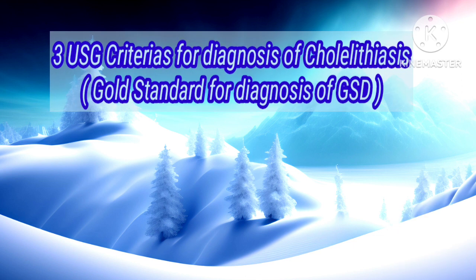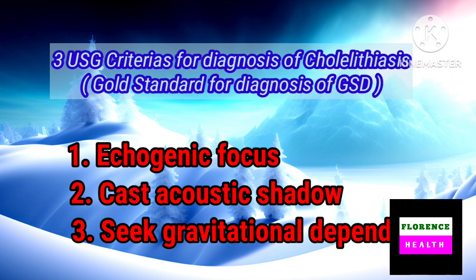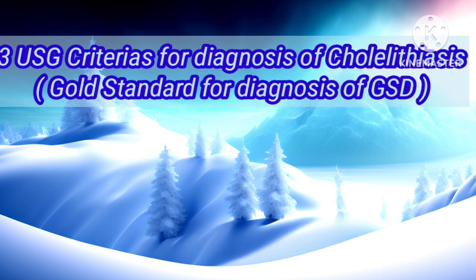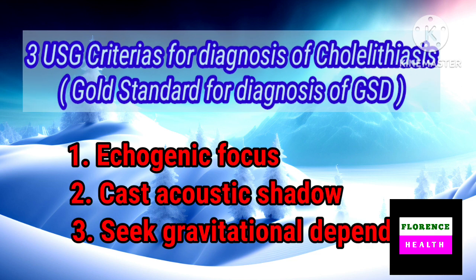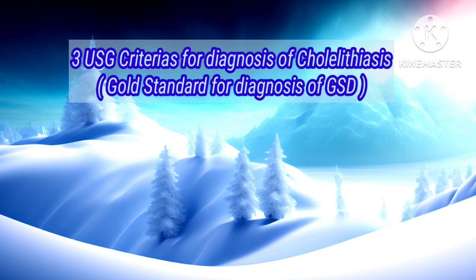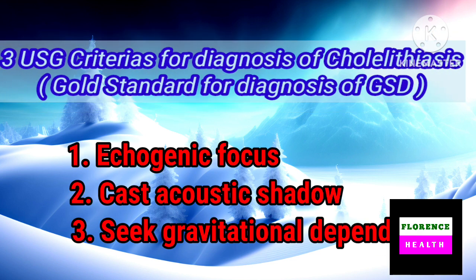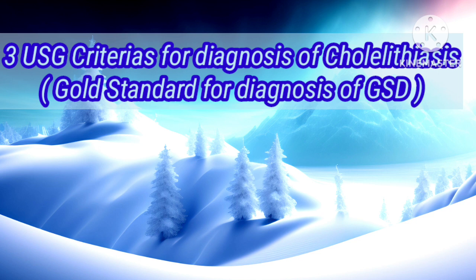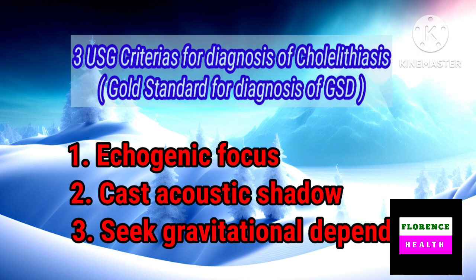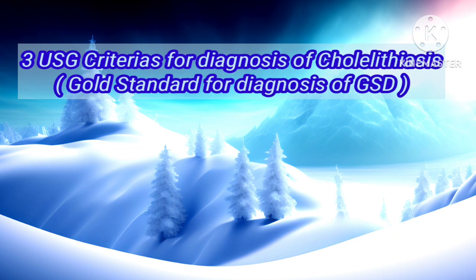There are three diagnostic criteria, or three sono-criteria, for diagnosis of cholelithiasis or gallstone disease. Those are: first, echogenic focus; second, cast acoustic shadow; third, seek gravitational dependence. These are the three sono-criteria for diagnosis of cholelithiasis on ultrasound. Let us discuss them one by one.